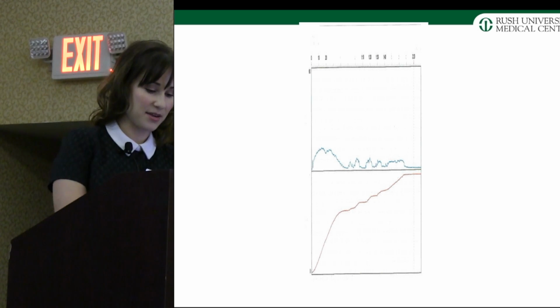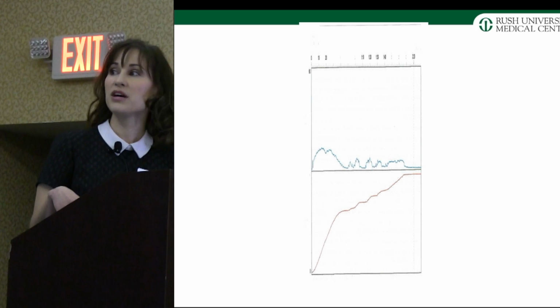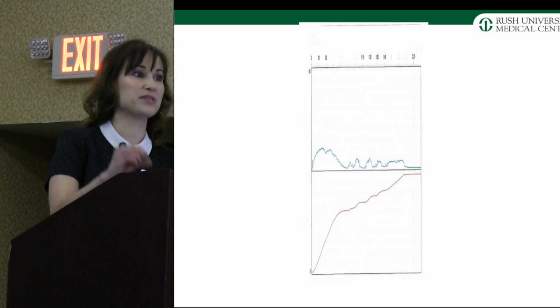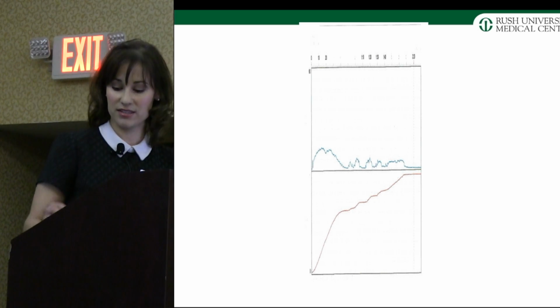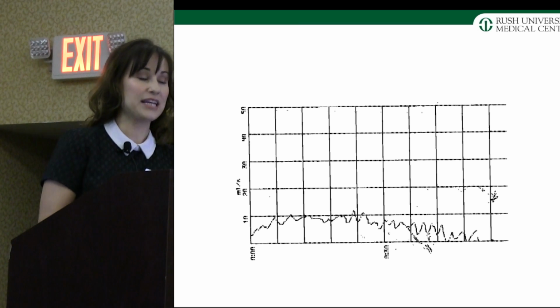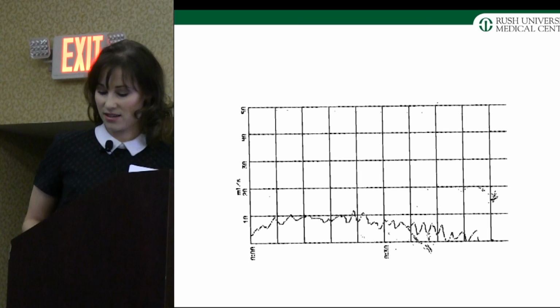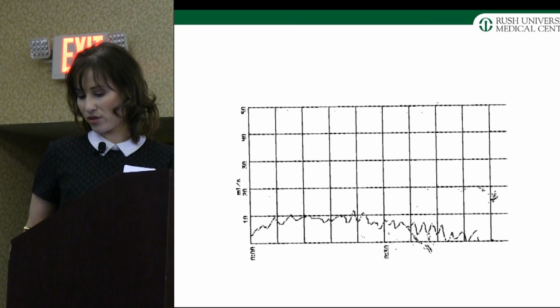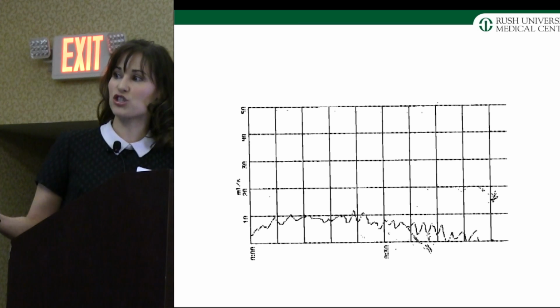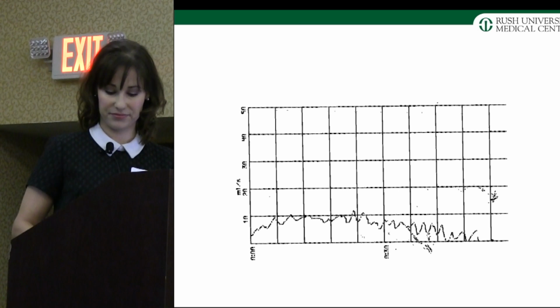I had a hard time in the beginning understanding the difference between an interrupted and an intermittent flow. So this is an interrupted flow because the urine stops and starts and stops and starts, and that's in contrast to your intermittent flow. There is a little bit of interruption at the end, but you can see, let me get this laser pointer. Here, it's just kind of not smooth. So this is what you call an intermittent flow.